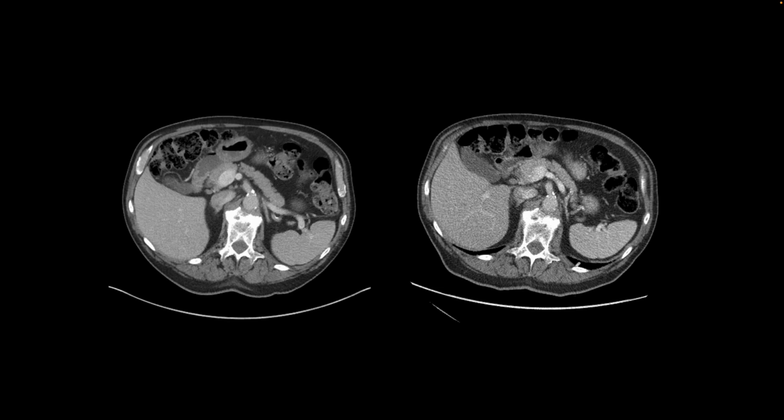So another artifact, these are two axial CT images from the same patient at two different time points. Look at the resolution of the images. You'll find that the image on the left is more uniform, better looking. The image on the right is pixely and not very well looking. And so what has happened here? The number of X-rays are less here compared to the other side. And what determines the number of X-rays?